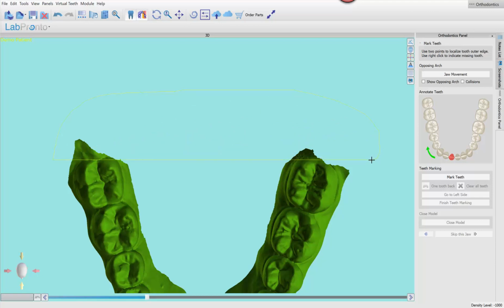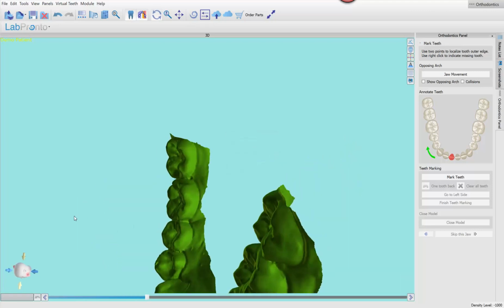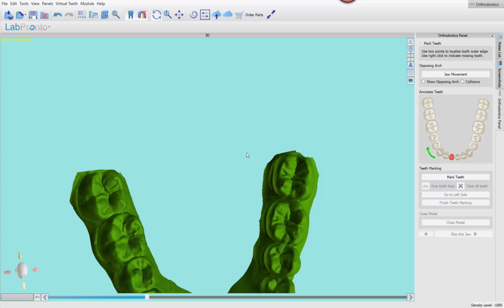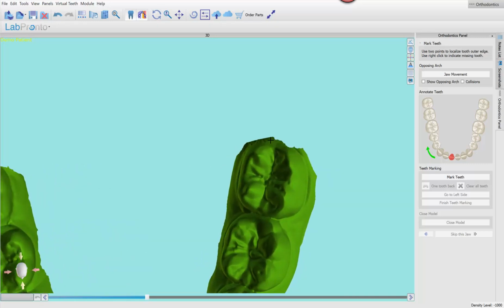I don't like that. I don't really actually want to cut that heel off, so I'm gonna try again. Okay. I don't want this thing hanging over here because that's gonna affect printing stability. It would have been nice to get more data back there. That's just the truth. That's quality control on our end. We should have done a better job there, but I'll figure out a way to address that.